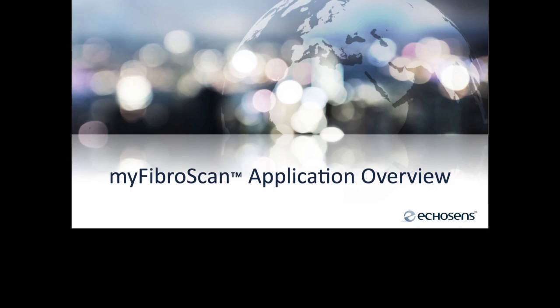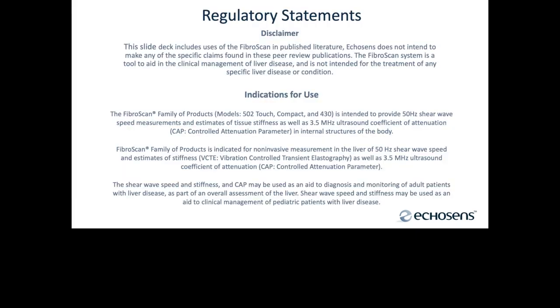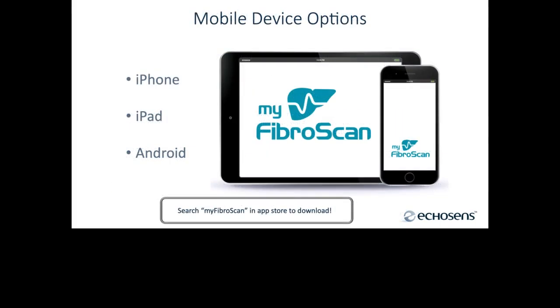In this short video, I will provide an orientation to the functions of the MyFibroScan application, which is available to any user of the FibroScan device. First of all, you'll want to download the MyFibroScan app. You can go to the App Store at either Apple or Android, search on the term MyFibroScan, and download the app free of charge. Please be aware that the iPhone, iPad, and any Android device is compatible with the application.